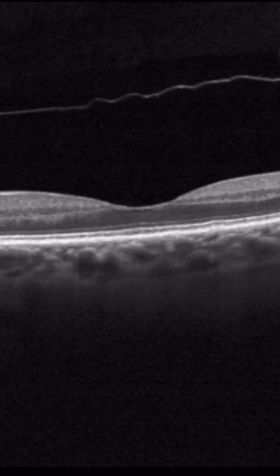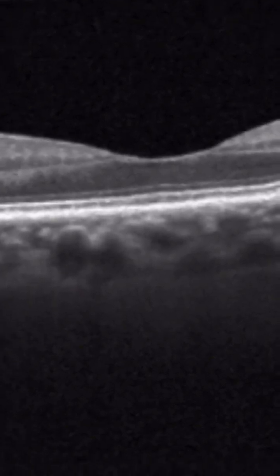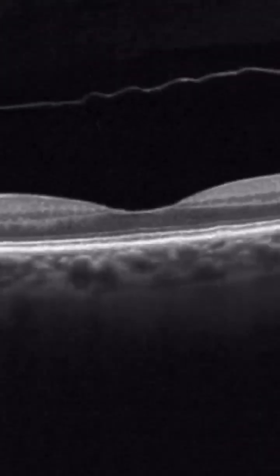Optically, there is nothing going on there. Whereas if you go into the vitreous, you can see that it has a texture or noise, if you want. So when you don't have any texture here, you can't just assume it's attached. If it's optically empty, you may assume that the vitreous is not present, it's just higher than the scan allows you to see, right?